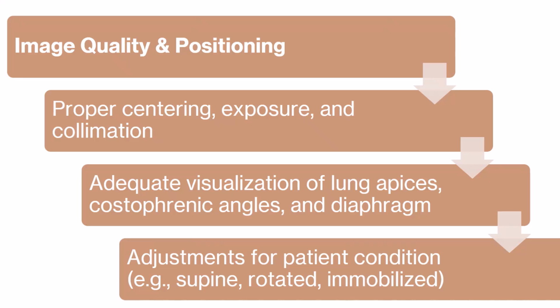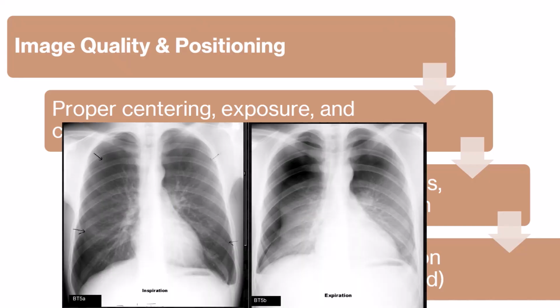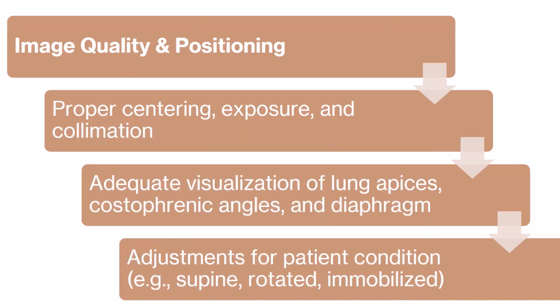When viewing the chest X-ray, what you'll find is that midline structures like the trachea and the spine should be centered. Also try to get the exposure on full inspiration, ideally 9 to 10 posterior visible ribs above the diaphragm, because poor inspiration can mimic consolidation or effusion.